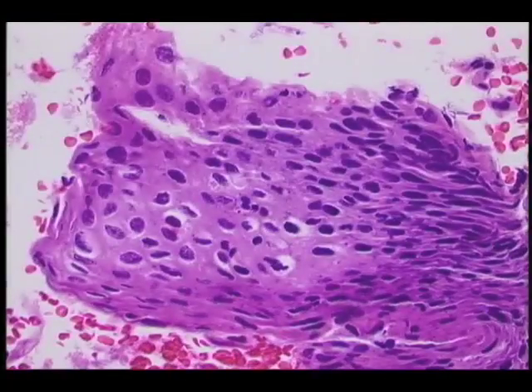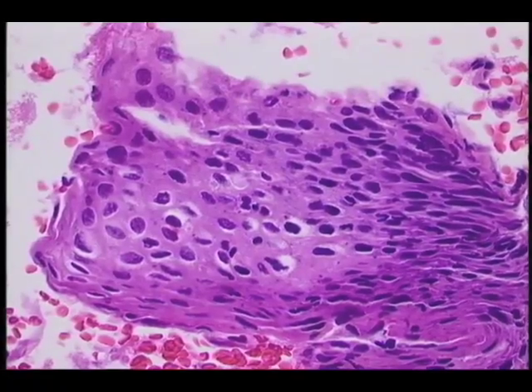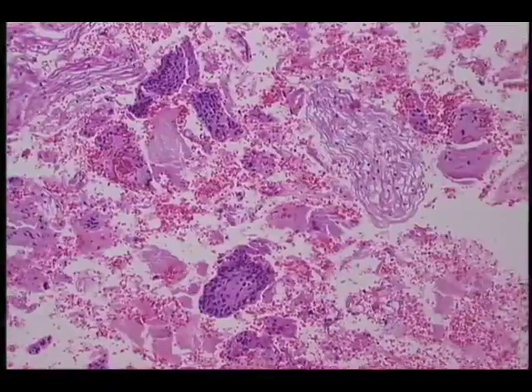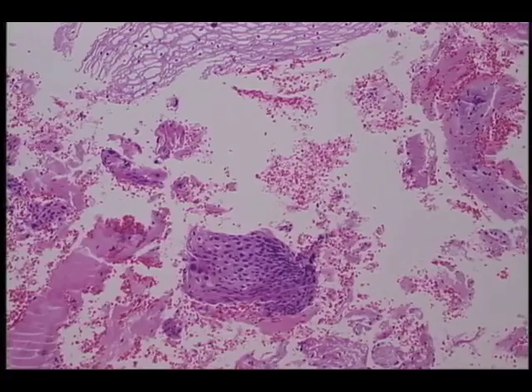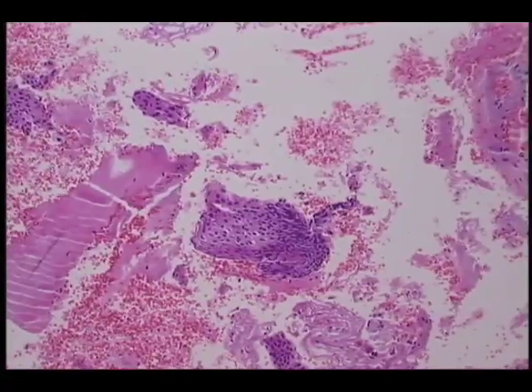and present us with some cells that are again binucleated and have irregular nuclear contours, and these cell fragments become diagnostic of CIN. As we go from deeper to deeper, or from section to section, the abnormality waxes and wanes, so that we can in fact make a diagnosis of CIN1 in this particular fragment based on this particular section.